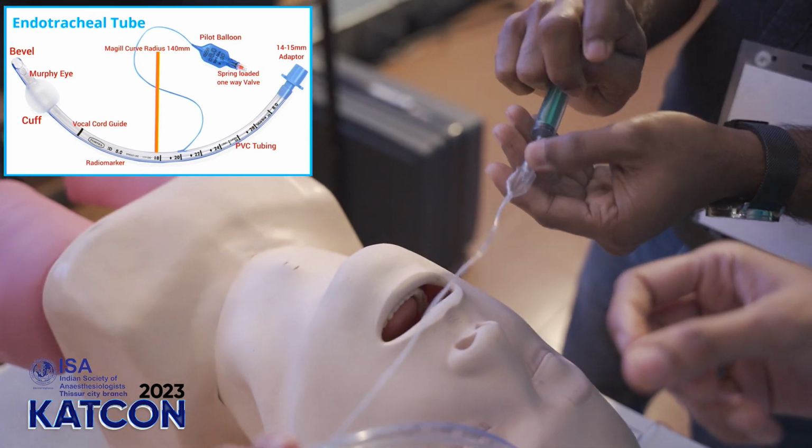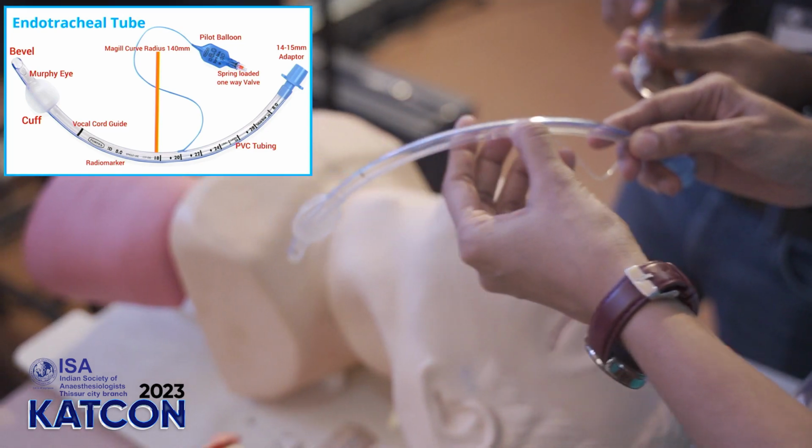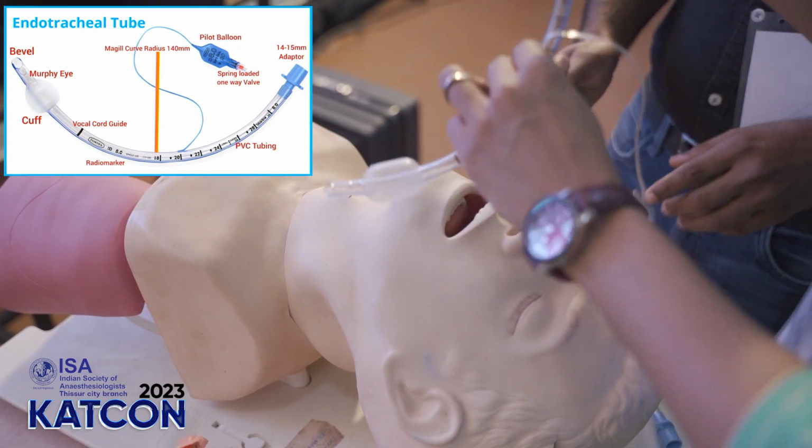It also has a radio opaque line, and this is the 15 mm adapter to which we will be attaching the circuit which will be connected to the anesthesia machine.